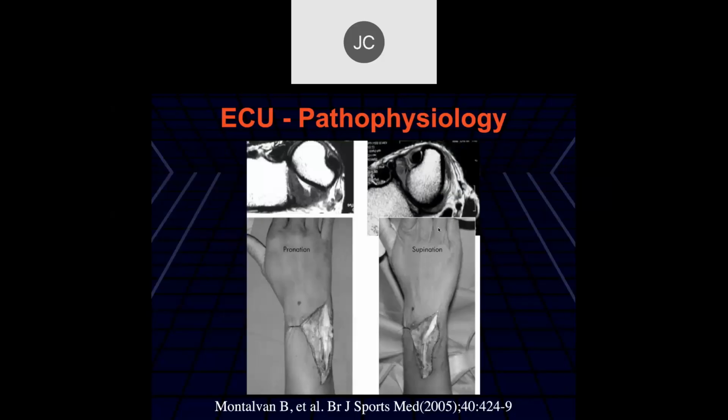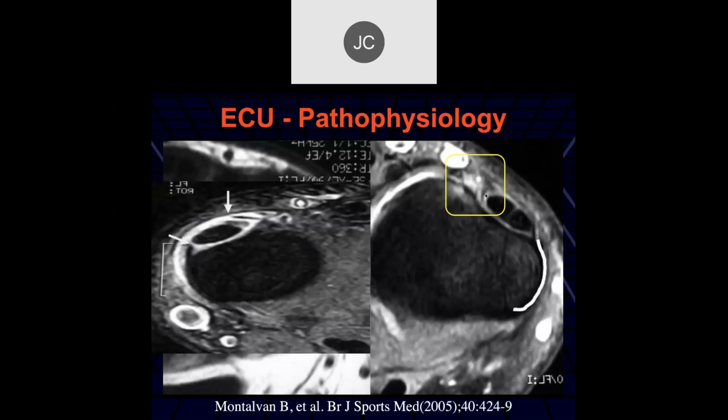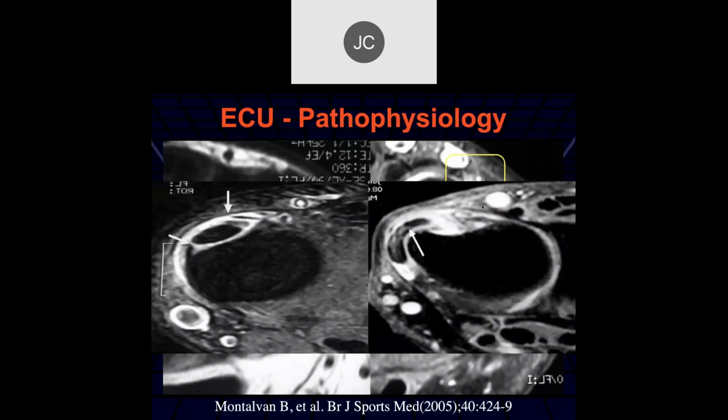This is a patient who, if you go from pronation to supination, you actually get motion of the tendon.